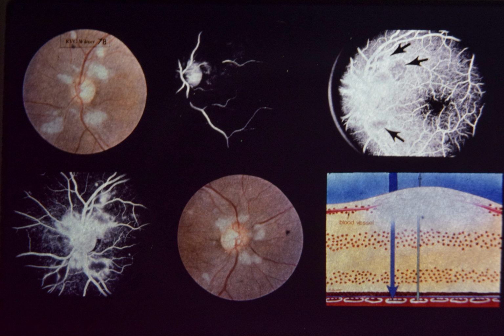Retinal capillary non-perfusion produces a microinfarct in the nerve fiber layer, which appears as a cotton wool spot clinically and a cytoid body histologically. Edema in the anterior retinal layers obstructs background choroidal fluorescence by interfering with the passage of blue wavelengths from camera to choroid and with the transmission of yellow-green wavelengths from choroid to camera. This is illustrated in the artist's sketch, lower right.